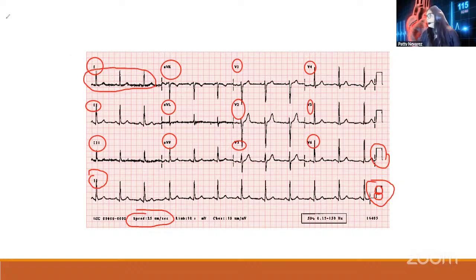Okay, so let me remove some of my beautiful images here. There you go. So when we look at an EKG, we see some morphology, and we think of these deflections, and they pretty much look the same when we don't know how to read an EKG. But this is going to give us all the information about what is happening in the heart. It is the report of the view of certain areas of the heart. So that is also super important.